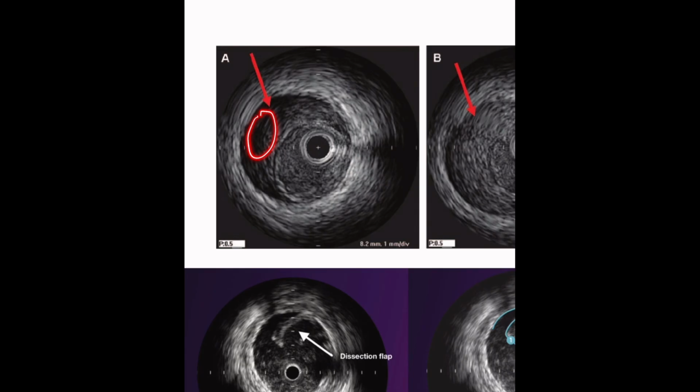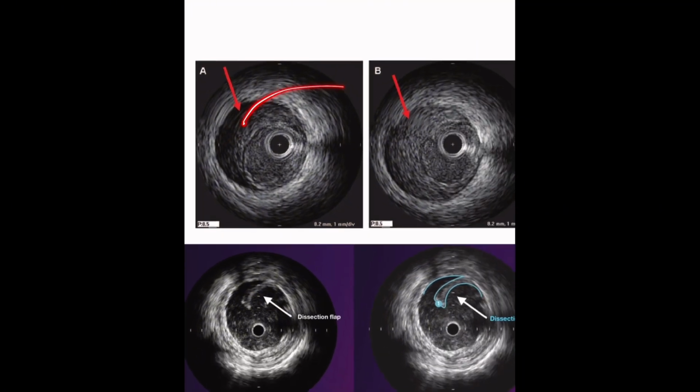So back here, this is stagnant blood, okay? So this blood is not moving. So then what happens from here to here? Now this texture looks similar to this texture, right? So both of these are moving blood. So what does that tell me? That tells me that at this point, this lumen is still connected to where the hematoma is. Now at this point, it wasn't, right?